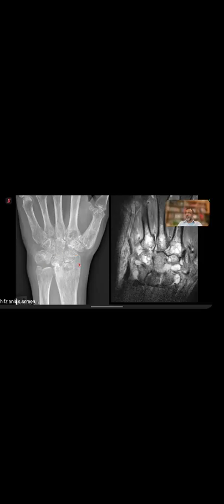Here you can see that there's marked osteopenia because of chronic gout. Now it's been there for some time. There's erosion there. Okay, I'll go back to the last slide in a minute. Okay, and you can see that there is a big erosion in the metacarpal base.